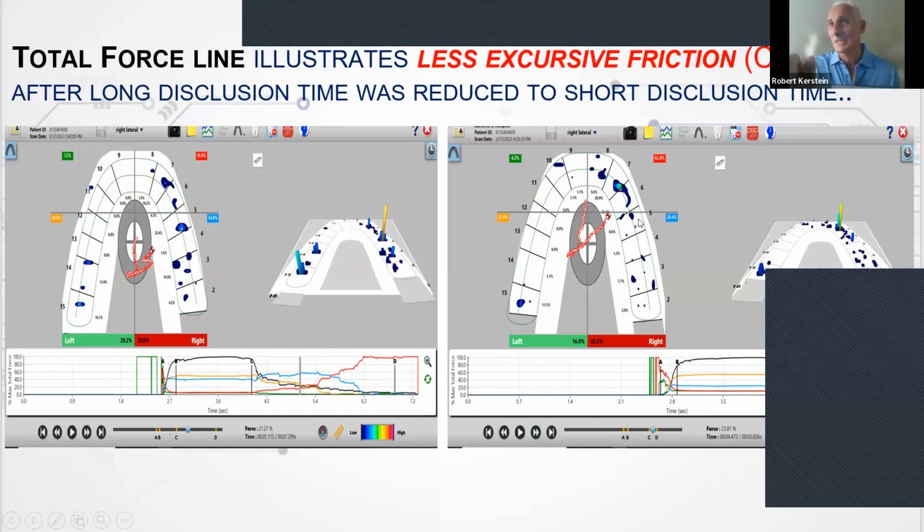It's not the percentages on the teeth. You can try to make those perfect, but unless you correct the closure parameters and the excursive parameters, you won't get the outcomes that we're able to get with the TScan. So there are timing and force parameter outcomes that are more important than whether you matched tooth number 3's force percentage to tooth number 14's force percentage. That's not as critical.